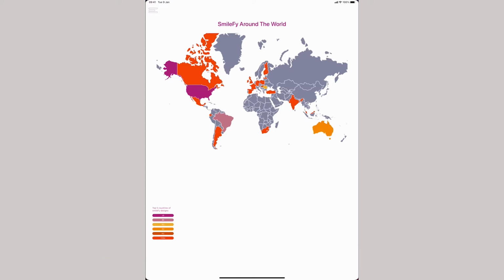The workflow works on all three devices. I'm going to use an iPad device today. And keep in mind that as with any other updates, new exciting updates will come up and we will keep you posted with the new tutorials. So let's get started.